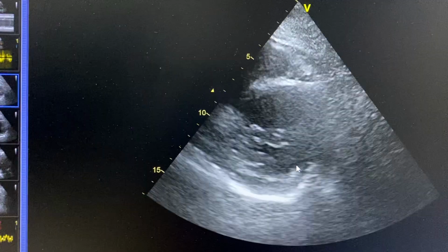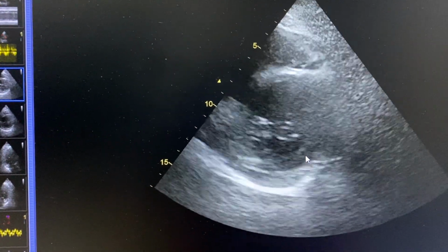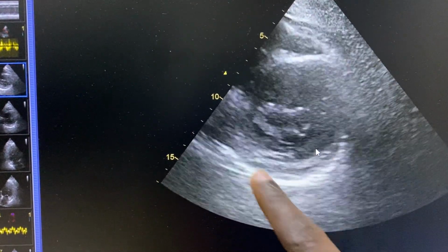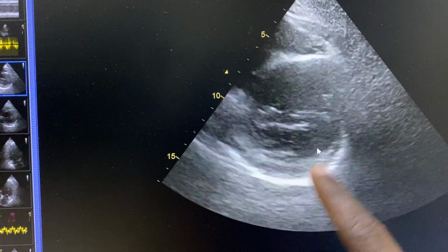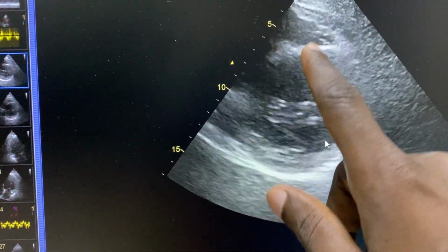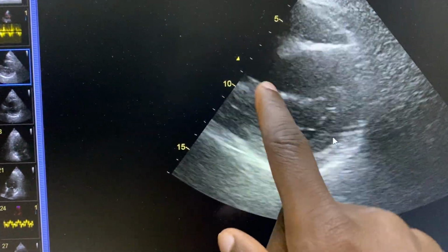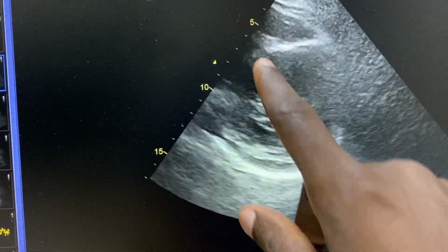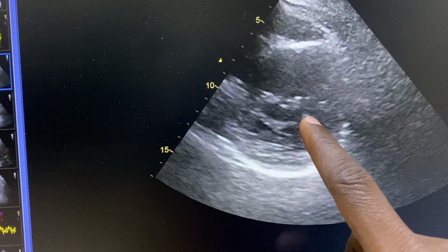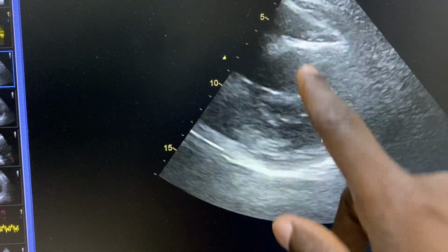Yeah. When you check this short axis here, remember from the handwritten notes we've been sharing, we were saying that the short axis view at the level of the mitral valve, that is the base, is where we have the anterior wall, inferior wall, the lateral wall, and then the septum. The septum has anterior septum, inferior septum, inferior, inferolateral or posterolateral, anterolateral, and then the anterior wall.